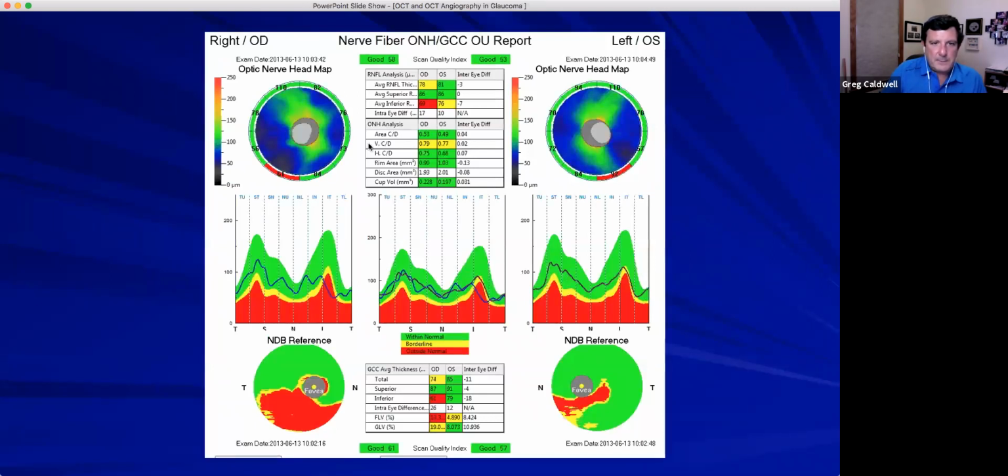And then another example, starting with the ganglion cell complex, known glaucoma patient, 11, 4, and 18. And that's why when you look at these and you're scratching your head, ocular hypertensives, funny looking nerves, run a scan on them. And if it's symmetric, it's most likely physiologic, what you got going on. Obviously, you want to follow them over time, see if asymmetry does develop. But you can see here the glaucoma is worse, at least OCT wise, in the right ganglion cell complex versus the left. And you can see that's what's causing this 11, 4, and 18.